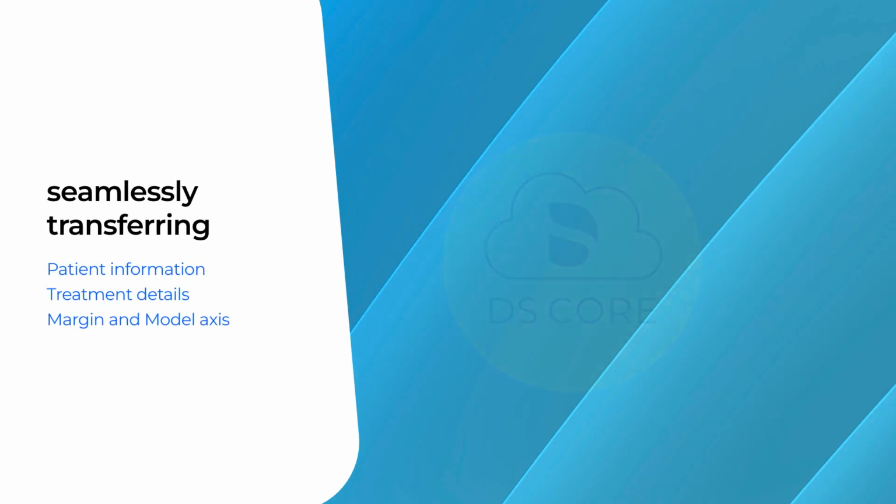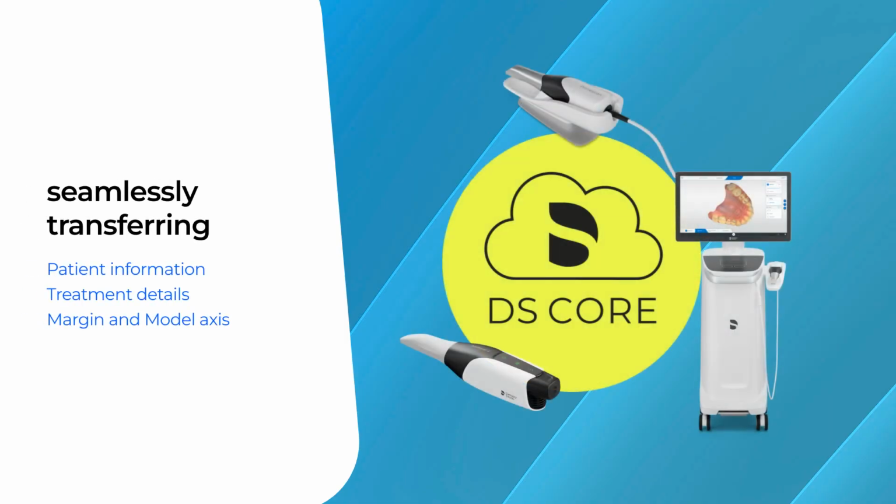Scans transferred from DS Core to CEREC software include patient information, treatment details, and preparation margins, allowing you to continue your work where you left off.